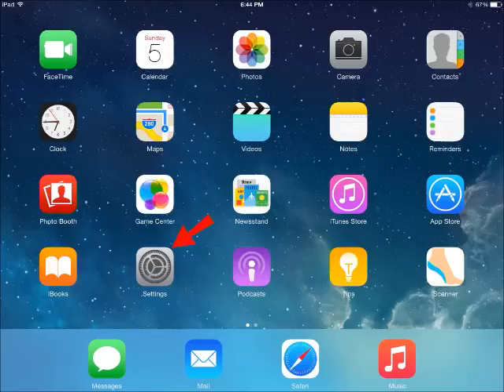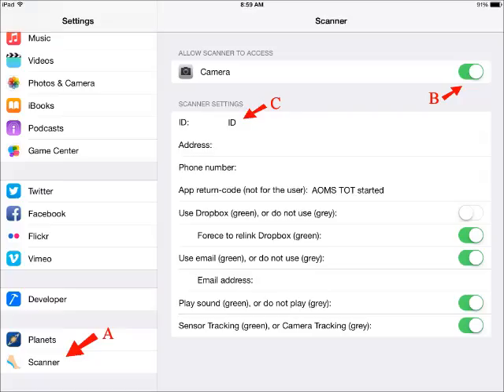If you want to make the app function more efficiently, you can go to the settings. On your iPad, press the Home button and you will see this screen. The settings icon is pointed by the red arrow. Tap it. Now you are in the settings. On the left-hand side, scroll down to near the bottom and you should find the app, identified by the icon with a foot and orthotic on it. Tap the icon. You will see contents on the right-hand side.